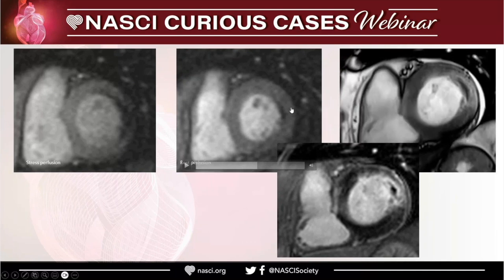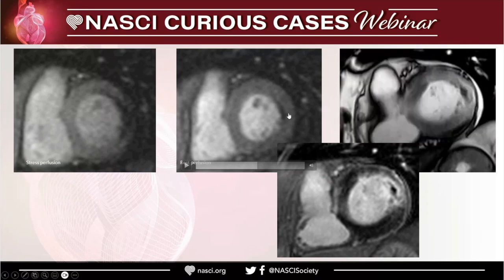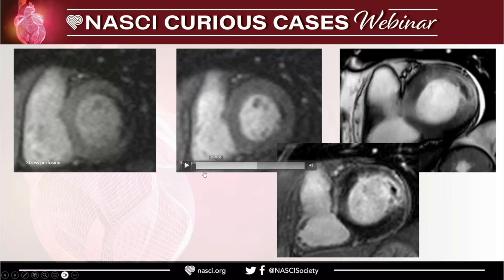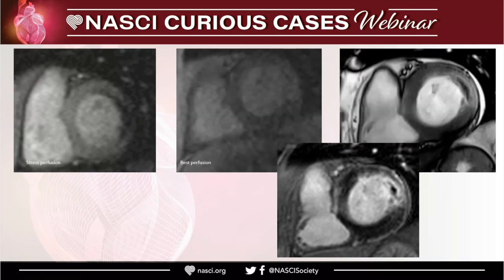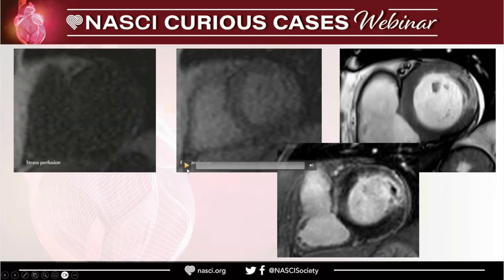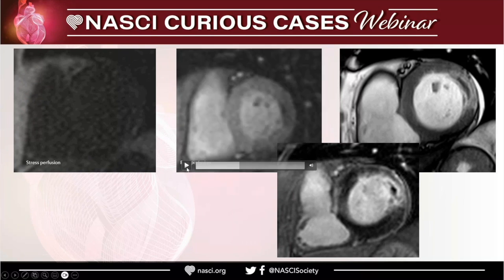So you agree that there will be some enhancement on the resting perfusion that can limit visualization of hypoattenuated area? Yeah, we agree. I agree. But it's a bit confusing. That's why in our center, I'm working in Southampton, UK, we are not doing rest perfusion.